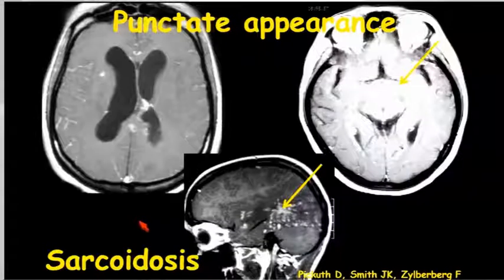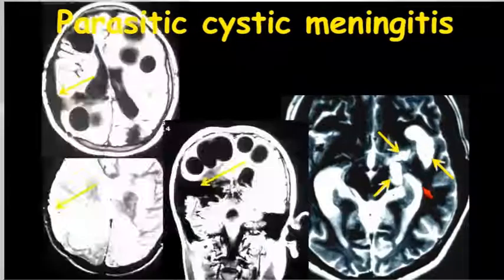That was an interesting case. Sarcoid can be a fooler, particularly loves the area around the optic chiasm. Sarcoid is one of those great mimickers that can affect the dura, the leptomeninges, can be a parenchymal lesion, can be associated with white matter lesions, but it's going to be on your differential for that nodular sort of base of brain appearance. You may see these little nodules hanging off cranial nerves, sort of like little dingle balls that might remind you of a carcinomatous meningitis type pattern. But keep this one tucked away for that basilar meningitic nodular pattern.